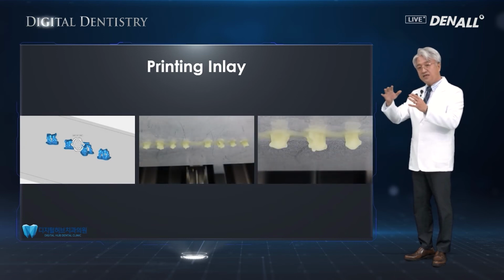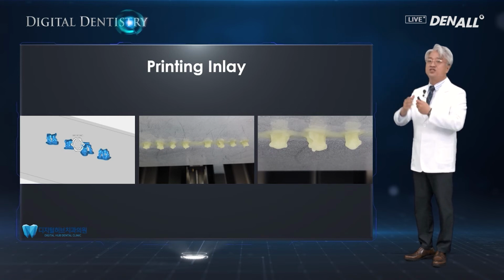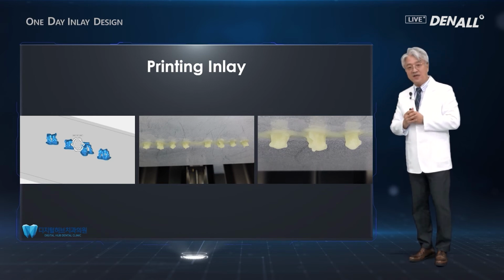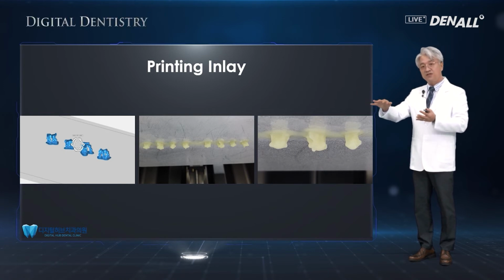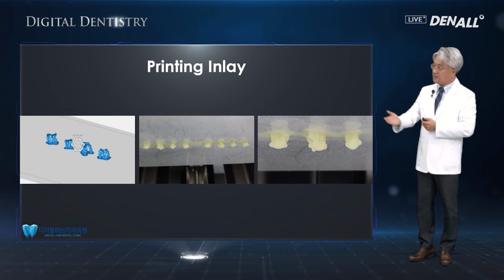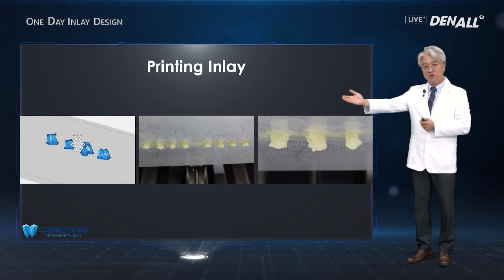In the milling inlay, the CAM software tools were used, and the inlay position in the blocks was set. In other words, it was about CAM operation, but in 3D printing, the same CAM approach can now be done with the slicing approach. And you also need to use supports, and how to use that support and all that shapes are explained in the far left image.